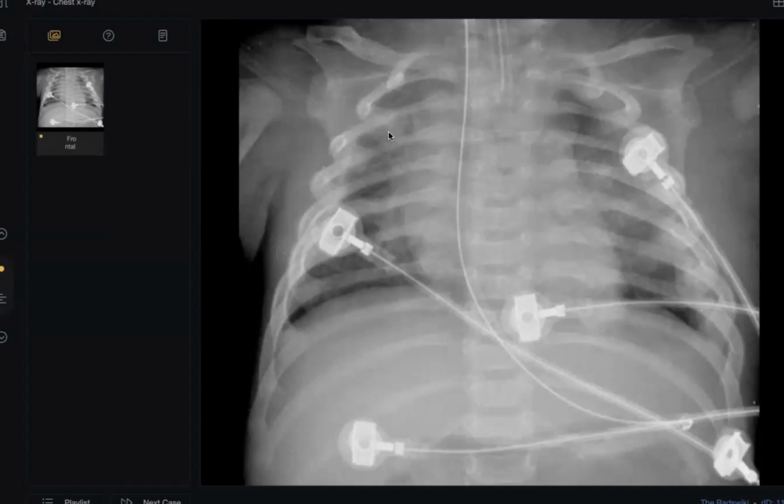Brilliant. Doctor, you are brilliant. Thank you. What's your diagnosis? My diagnosis would be non-accidental injury. Thank you, thank you. See, my colleagues, the doctor smashed the case from first to second.